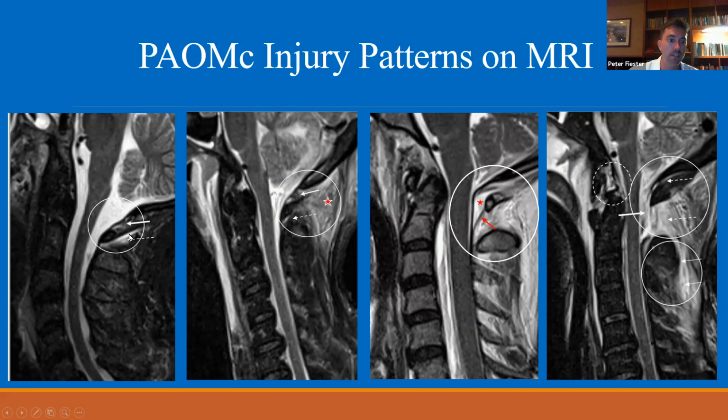And you can have edema within this little compartment in the setting of a C2 fracture. A study came out that demonstrated that this can actually be a finding of an occult C2 fracture. If you don't have a CT to look at, it's a secondary finding. So those are the different injury patterns. But again, this demonstrates the importance of the soft tissue windows on CT exam.